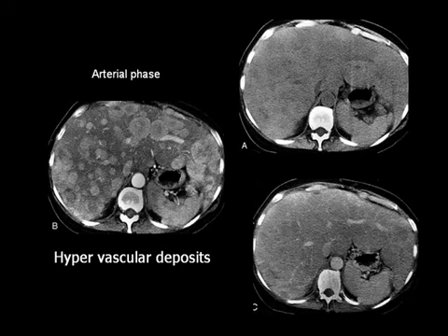How do we obtain this arterial phase and the venous phase? Thanks to the new technology, which is known as the multi-detector machines. They are very fast machines. They can scan the contrast material while in the arteries and also while in the veins and later on after that. So we have 3 phases of scanning depending on the flow of contrast. We scan the liver once in the arterial phase, in the venous phase, and in the delayed phase.